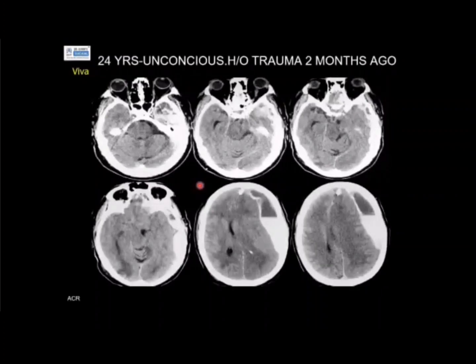Coming to the level of the midbrain, I can see that there is a mass effect on the left hemi-midbrain, denoting left-sided uncal herniation, with obliteration of the ambient cistern on the right, meaning that there is mass effect on the right side of the midbrain as well. So in conclusion, this is an acute emergency because of the mass effect and the intracranial herniation.